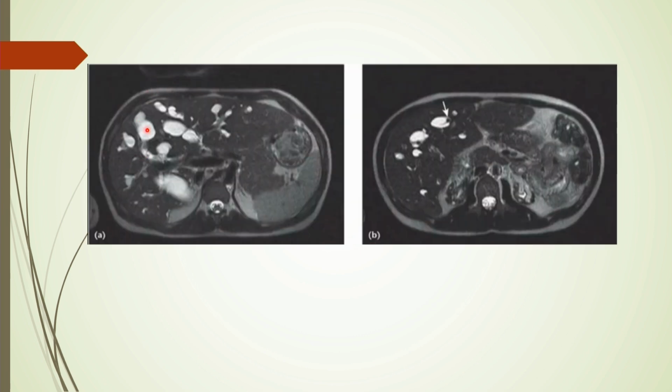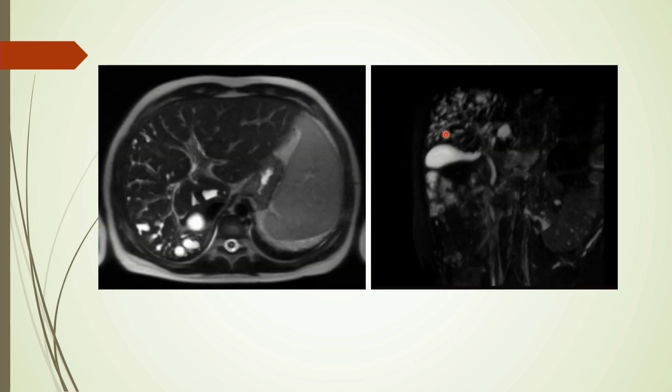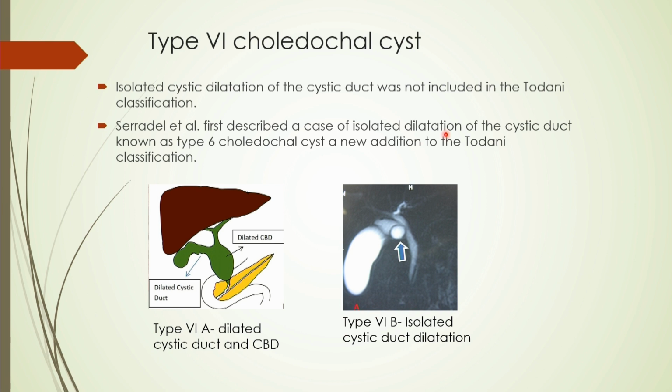Various associations include congenital hepatic fibrosis, medullary sponge kidney, ADPKD, and ARPKD. Here we can see multifocal, multisegmental, intrahepatic cystic lesions communicating with the biliary tree, and here we can see the classical central dot sign with the portal radical within the dilated cyst. This is Caroli's disease.